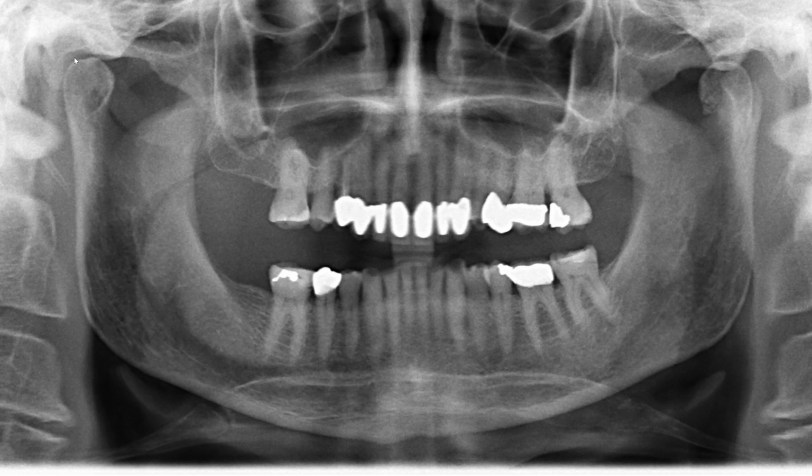What about the border? Nice, smooth and continuous border that we see. Over to the left, here's that border that I can trace and I lose it. And then there's another border that I can trace. So there's something going on that we want to pay close attention to.